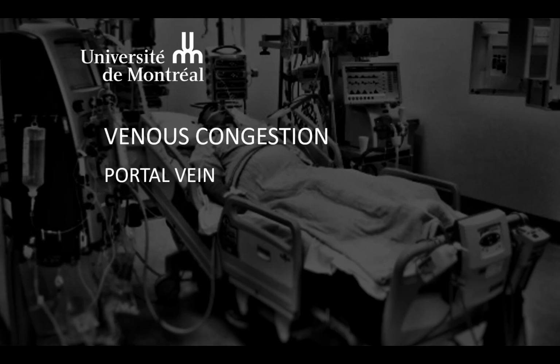This is part of a series of video tutorials and reviews about venous congestion. This video will focus on portal vein assessment. The three other videos of this series will deal with cardiac physiology and hepatic vein assessment, intrarenal Doppler ultrasound, and integration of all venous congestion profiles.